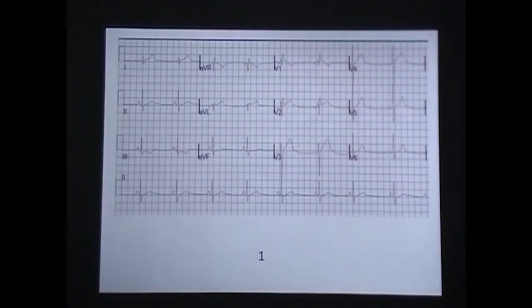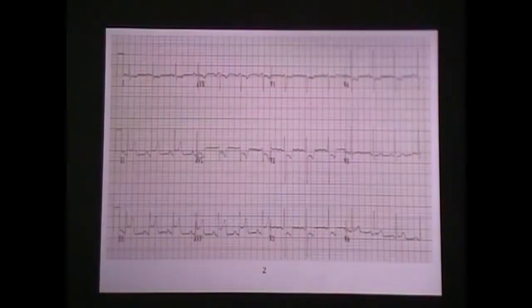Yes. So if you remember the handout I gave you with the anterior and lateral, you can have reciprocal changes in 2, 3, AVF. And if you look at 1, you can see right here we got a little elevation. So if I start at 1 and see a little elevation, I automatically go over and look at my precordial leads and then come back, because I know my injury pattern for a lateral is 5, 6, 1, AVL. And anytime it happens on the left side of the heart, you're going to possibly get reciprocal changes on the right side. Good. Let's go on to the next slide.